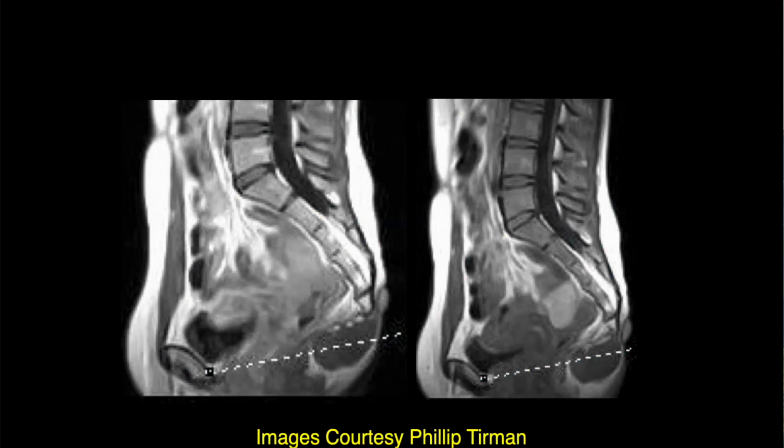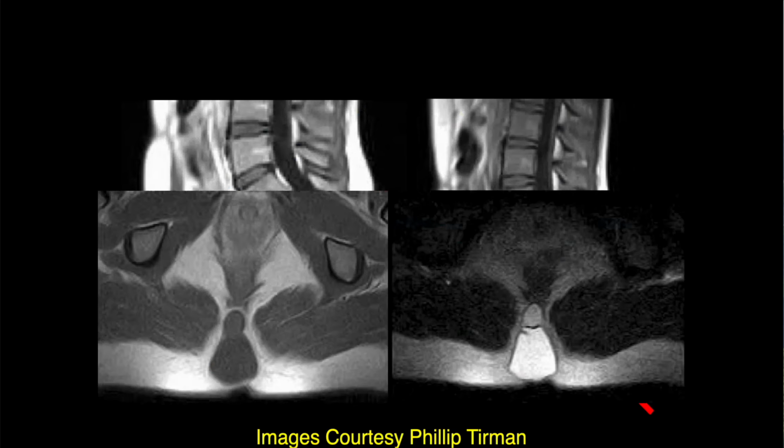Okay. Robert? All right. Let's see. Here we're looking at, I think, the sacrum. It looks like there's a cystic structure at the bottom of the field of view. At least it's low in signal on the T1, lower than fat anyway. Obviously abnormality of the coccyx down here. And if we do oblique axial images, now we have a T2, which does look like it's now fluid containing.